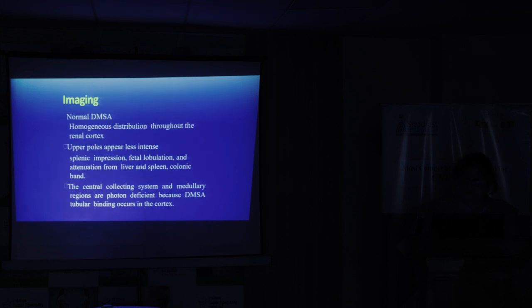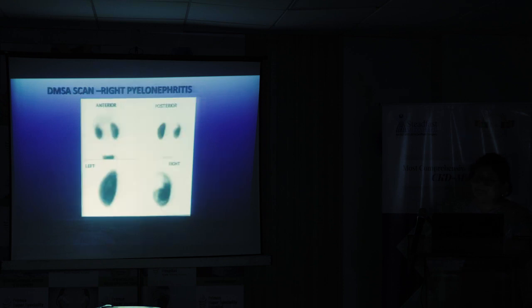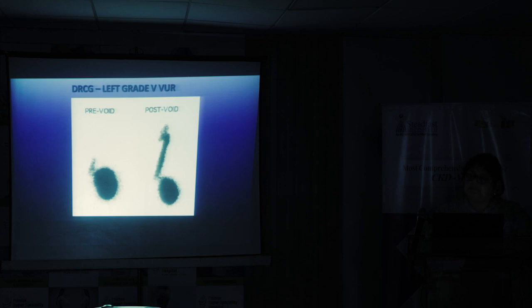So we've already gone through the DMSA. This is what a normal DMSA looks like. This is the pyelonephritis kidney. This is when the scar becomes more organized. So you see a more structured scar. The same patient. The patient had a reflux.